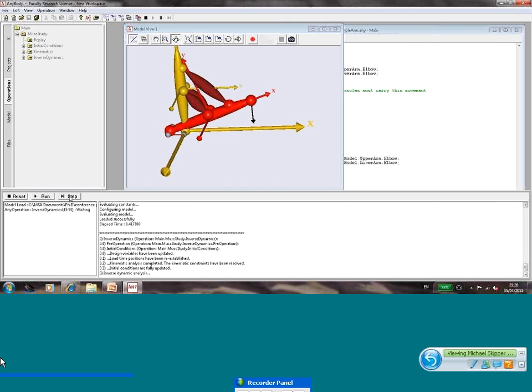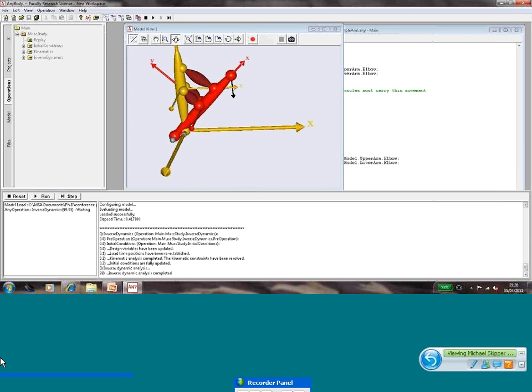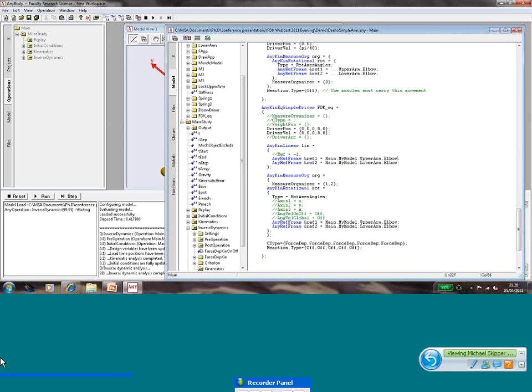Go a little further here, and we will of course see that, as we saw in the animation from before, it moves around. It will move all the way up here to the end of the analysis, which is 99 times. So there we go. Now we actually have a possibility of controlling the joint in terms of the forces here.